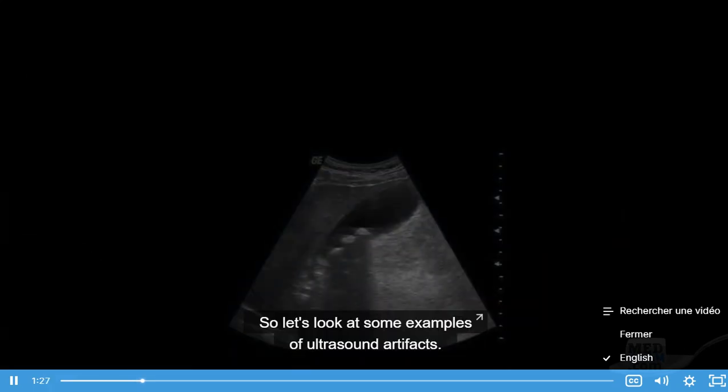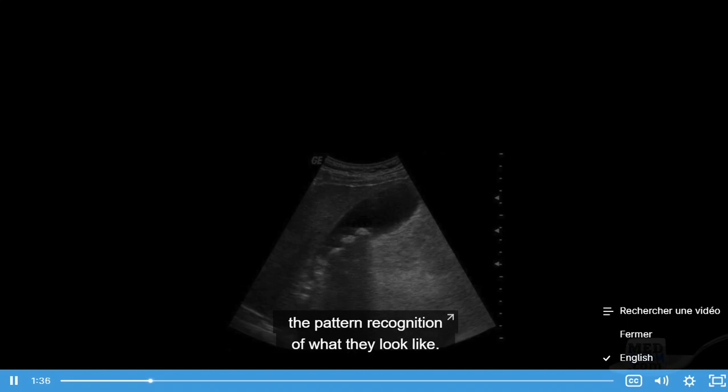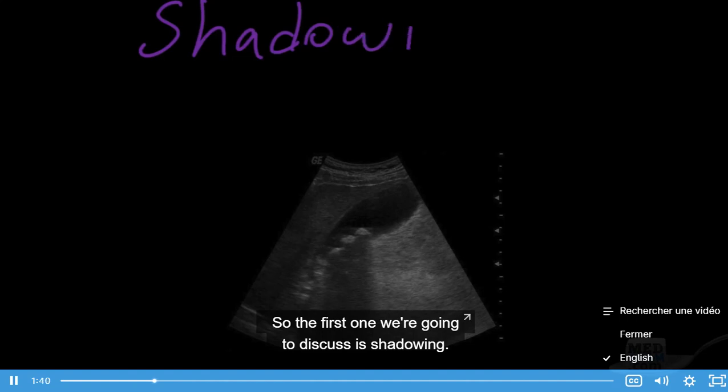So let's look at some examples of ultrasound artifacts. It's important both to understand why the artifacts occur and also be able to have the pattern recognition of what they look like. So the first one we're going to discuss is shadowing. In shadowing, the concept is pretty simple.